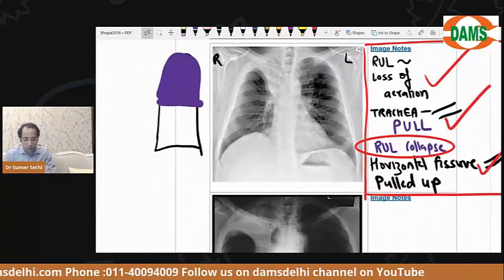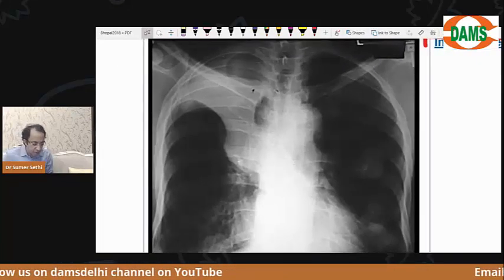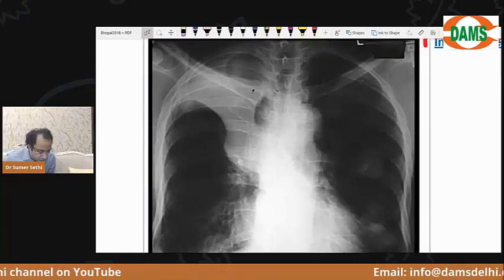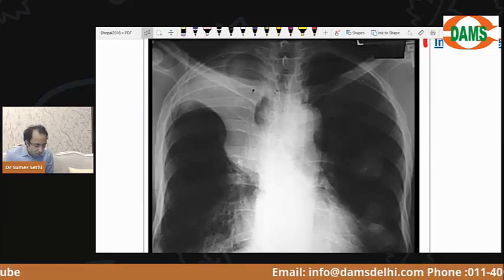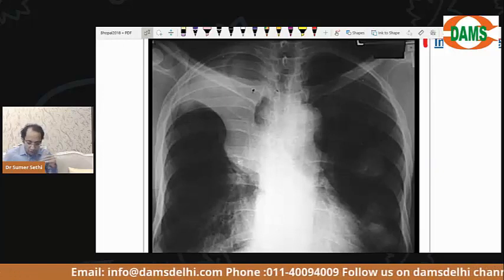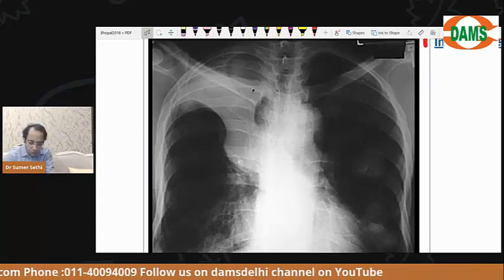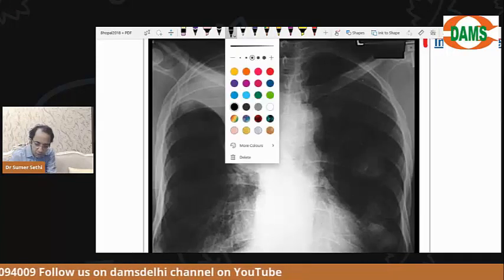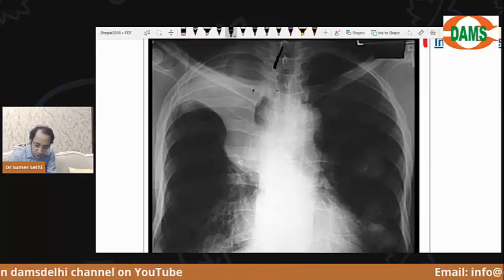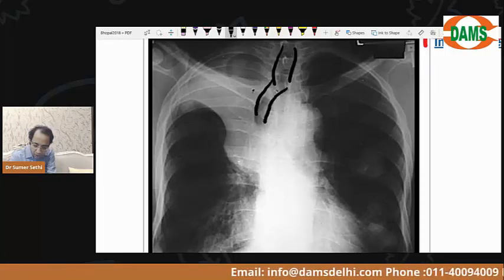Now let's see the second question. It is very, very important to understand. Just keep looking, let us unfold things more and more. Now listen to me and answer. If this is your trachea, this is your right bronchus.